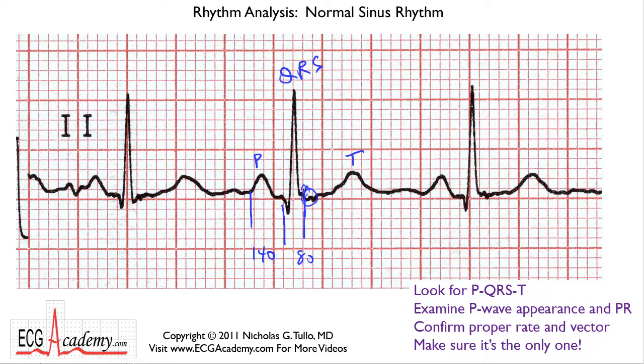And the QT interval, of course, we measure, and you can count the corrected QT as normal or abnormal. It looks normal because it's less than half the R to R interval, as we discussed in the previous section. But what about this P wave? Remember, if I had just looked at this P wave, I would say, well, what the heck is this little jiggle here? Is that the P wave? Well, you can see that jiggle is absent in this beat and it's absent in this beat. So it's noise. It's high-frequency noise. The patient maybe moved around just for a fraction of a second. So you really kind of have to scan across and see what your favorite P wave is.